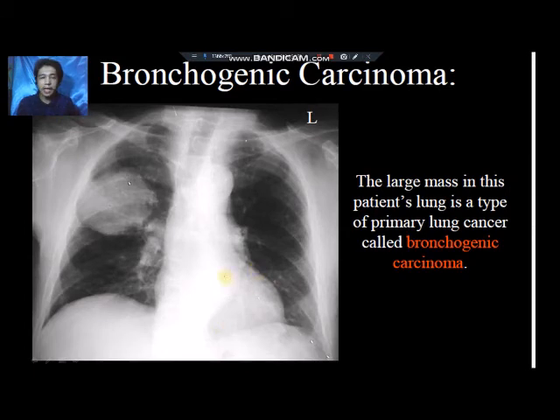Okay, so if we see a mass, for example, if we see an opacity when the patient has an X-ray, as you can observe, it still looks like a fluid accumulation, right? So in order for us to demonstrate if this is really a mass, we need a lateral projection. So we take a lateral projection of the patient now. And if after the lateral projection the radiologist evaluates the film and says this is really a mass, the patient will be recommended for CT scan right away.